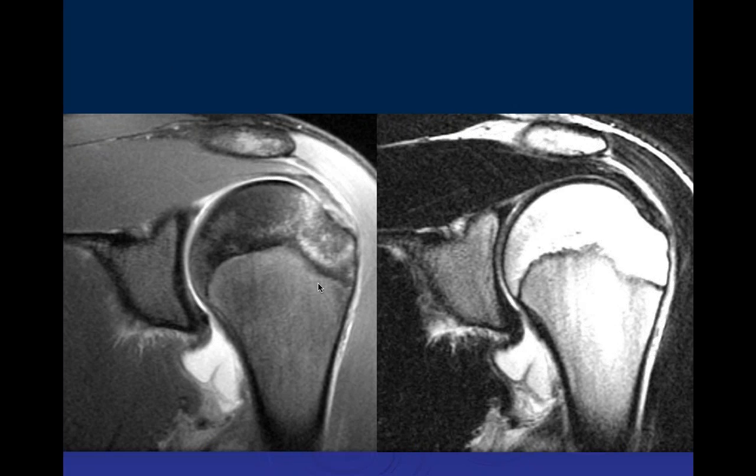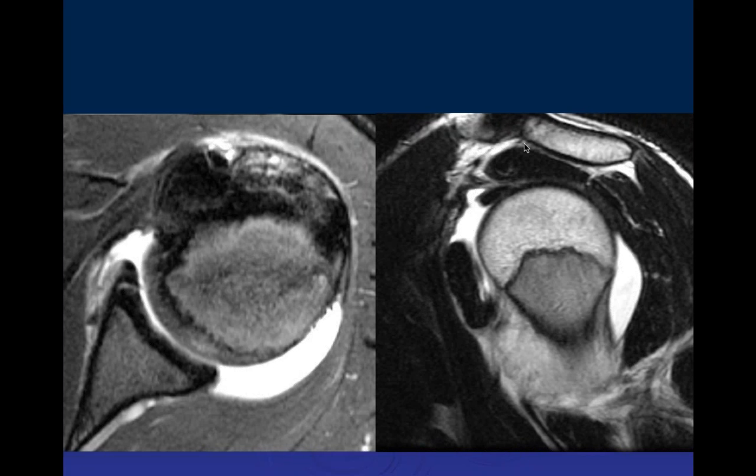So actually, it's maybe a little posterior, maybe like infraspinatus. There are some traction changes, and then at the axillary pouch again we see a lot of contrast going inferiorly. So it's a little contrast extravasation. So you're worried about inferior glenohumeral ligament avulsion injury and impaction injury. Yeah. So we got an axial. Looks like the anterior labrum, it looks like there's also a tear. And then on the sagittal image, again, it just shows the extent of that inferior glenohumeral ligament disruption.